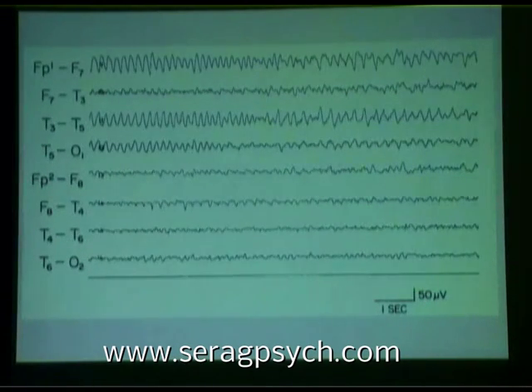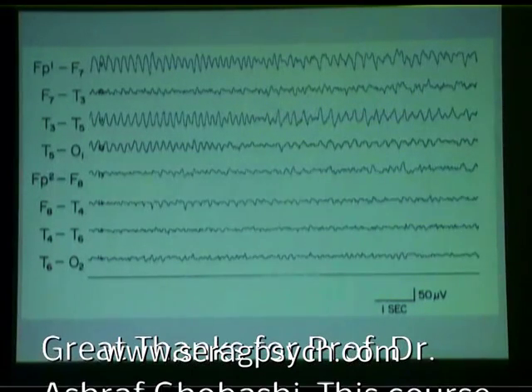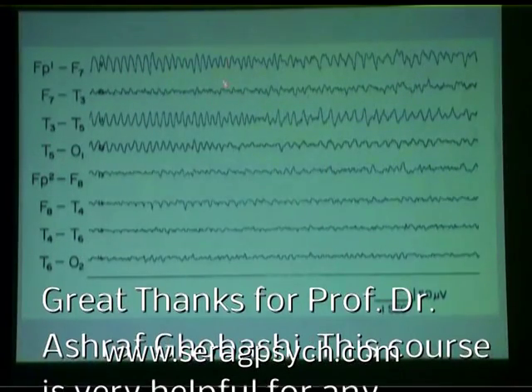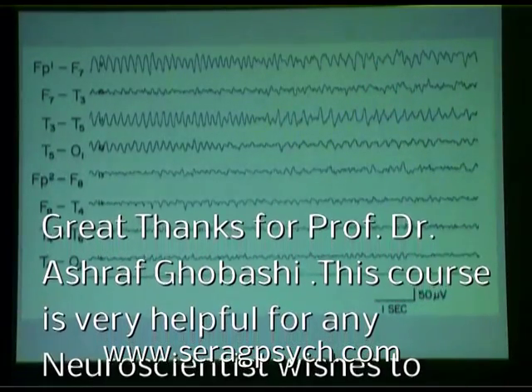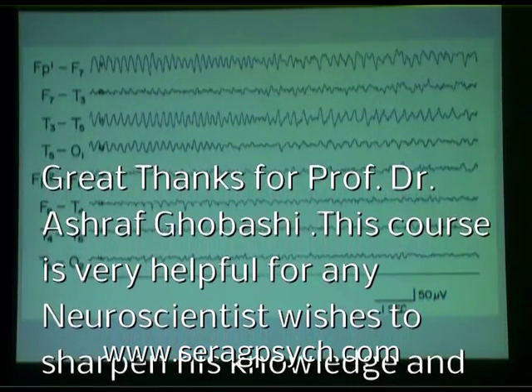Next, please. Same seizure. Notice it's got even a third morphology here, and now a fourth morphology. See? So it continues to evolve. And we found that focal seizures in adults or children evolve in about 98% of cases. You can see that we're going from very rhythmic waves here to slower sequential spikes as inhibition starts getting in there. Notice the involvement of the other side. Finally it gets over to the contralateral temporal lobe.